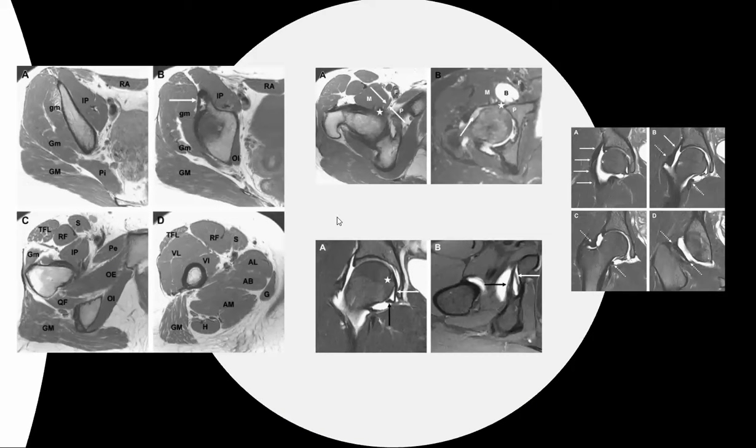There are many important tendon attachments which include the sartorius origin, anterior superior iliac spine, the rectus femoris origin from the anterior inferior iliac spine and superior acetabular rim, the iliopsoas insertion, lesser trochanter of the femur, and the gluteus minimus and medius insertions onto the greater trochanter of the femur. The adductor group of origin tendons insert onto the pubis, and the hamstring group come from the ischial tuberosity, because these are the sites of common avulsion injuries.